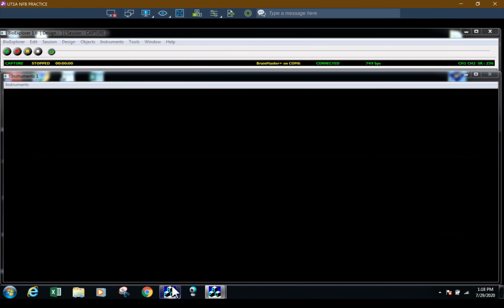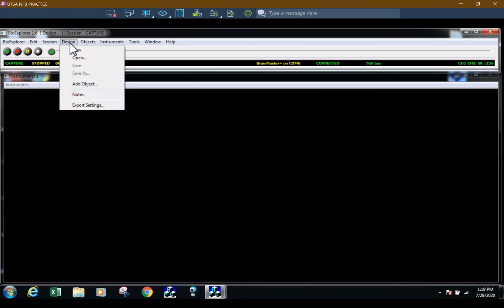And so let's pretend this is a session with a client. When you're going to start a session with a client, you need to first open a design that you're going to use to run the session. To open a design, we're going to go up to here where it says design and open.